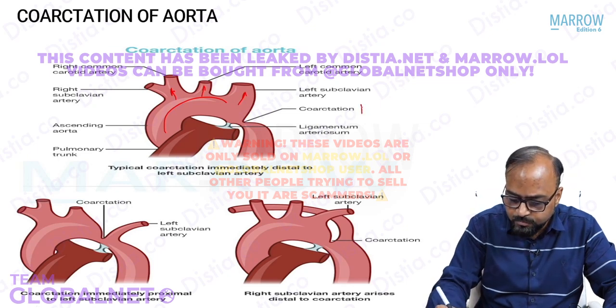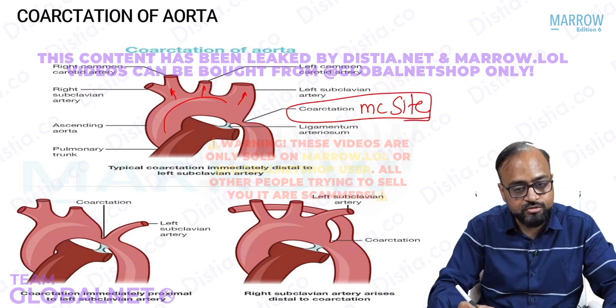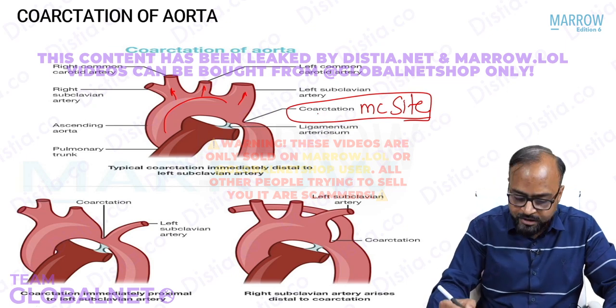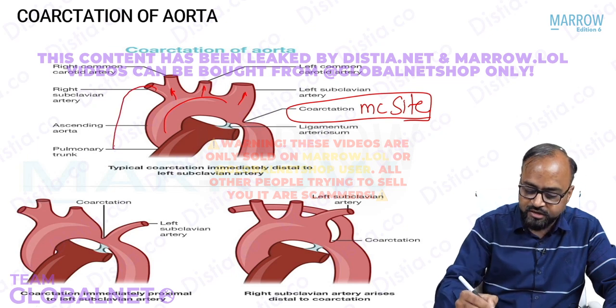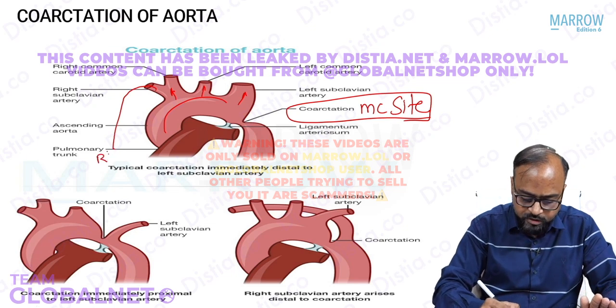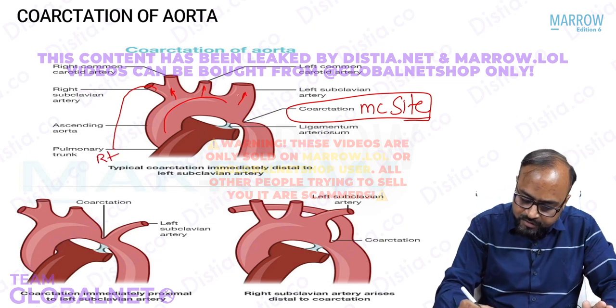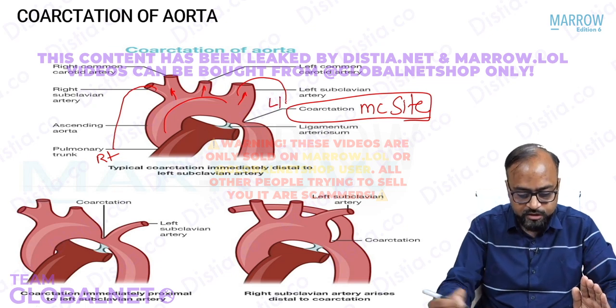We discussed that the most common site of coarctation is this, at the ductal insertion or just distal to the ductal insertion, distal to the subclavian artery. So in this case, from this subclavian artery, the internal thoracic artery will arise, and this will give rise to collaterals on the right side. From this subclavian artery, again, the internal thoracic artery will arise, so this will give rise to collaterals on the left side.